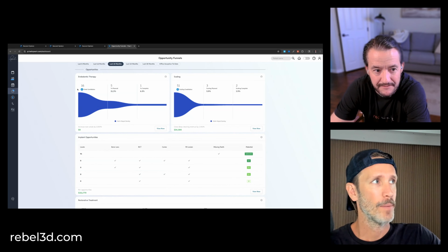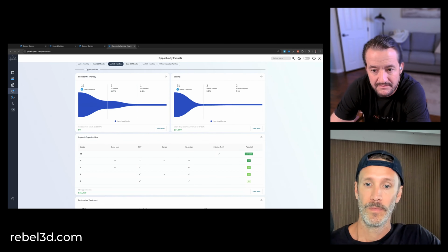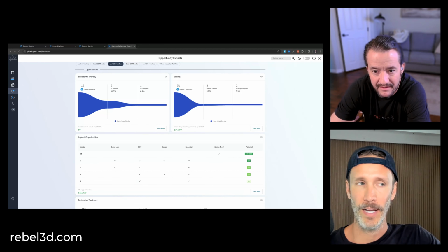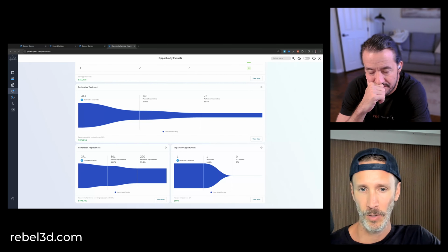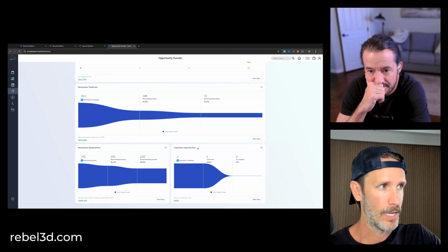Say, like here in my practice, there's 16 patients that have potential endodontic therapy. So, oh, okay, well, if I had a specialist, that's like 2 days worth of endo right there, right? Or like this is a good one. Look, impaction opportunities. We only have one patient that has impaction opportunities. So probably not great for surgery in my practice.